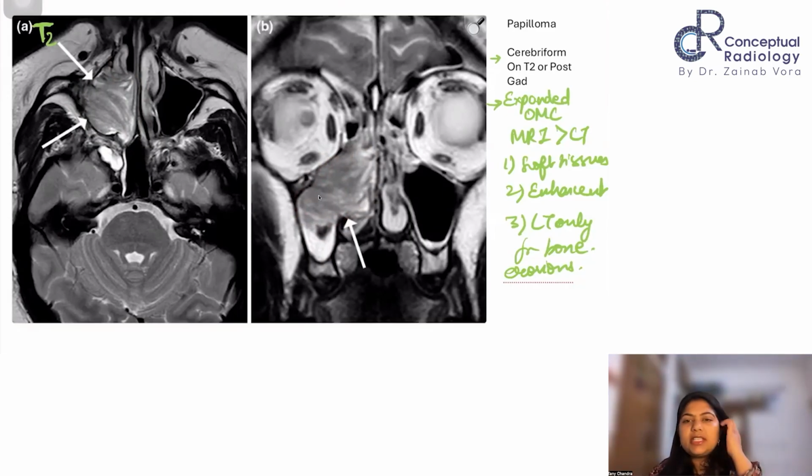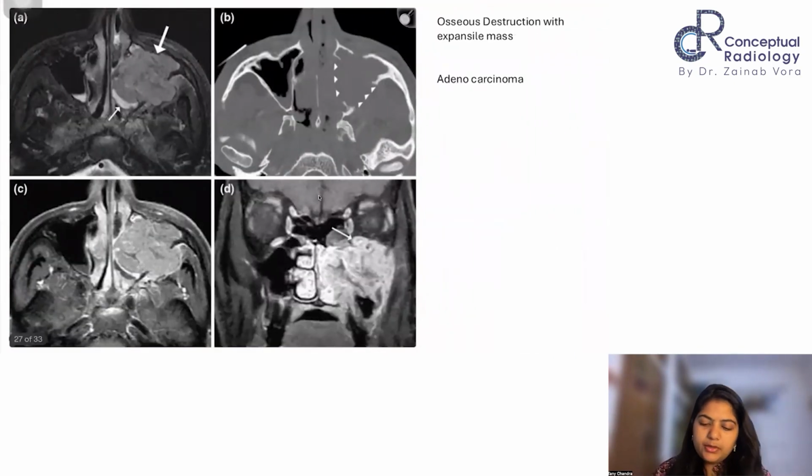Even if you have just a CT, go ahead and you can get an MRI for correlation and for finding out what this is. This kind of appearance, right? Like this. So that is a papilloma. Okay. This particular pattern can be seen. I have picked up the images of T2 where we can see it very well. You can also see it well on a contrast, right? Next, let's move on to another example.